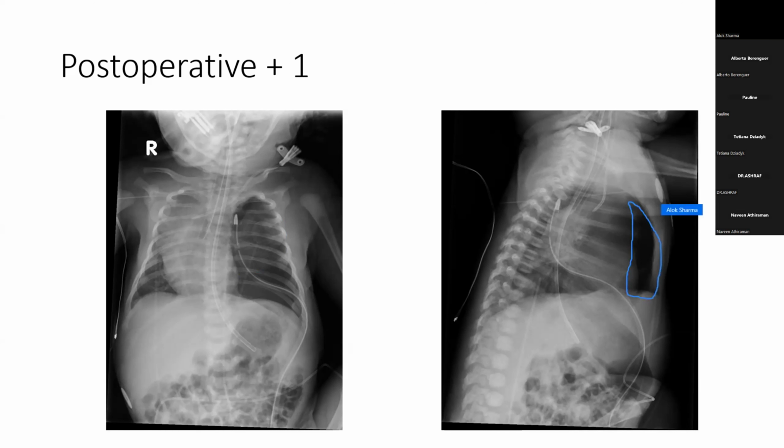That's an anterior pocket of air just in front of the heart. It's beautiful. Not babies. And then they said, you are following the course for lung ultrasound. Can you look with the ultrasound machine if it's mediastinal air or is it pneumothorax, and what we have to do? I thought, no, I can't, but I can try, and I can make some good image, I think.